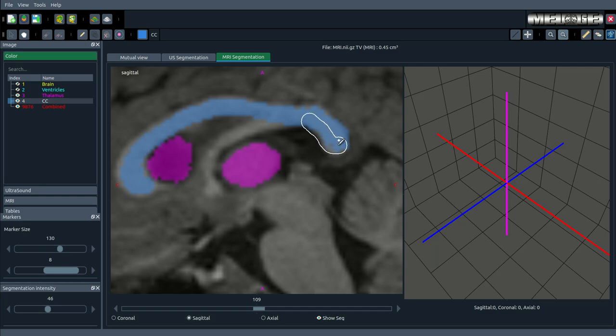The activated volume here is like this, 0.47. After finishing everything, let's remove this additional part. It cannot be removed because it has not been activated. If I activate this here, you can see I can remove it, and it does not remove the other parts that are not activated. So you are just removing the desired part.